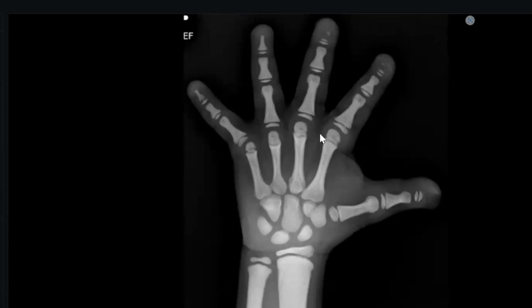Next candidate. Any candidate? Sir, Assalamu alaikum. I'm candidate 12. Okay. Now, tell me the finding.